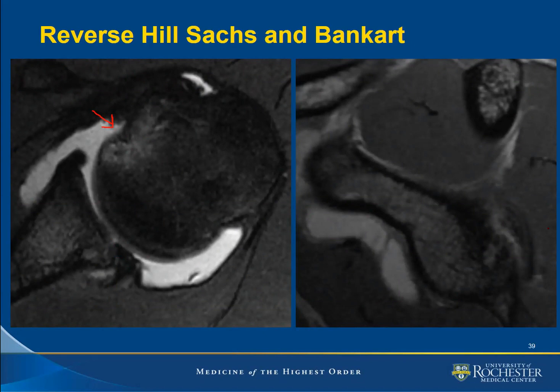Sometimes this is better seen on your sagittal T1 or proton density images, where you can see nicely this displaced bony fragment, displaced posteriorly, compatible with a reverse bony Bankart.